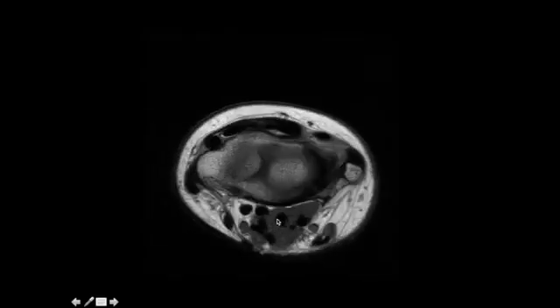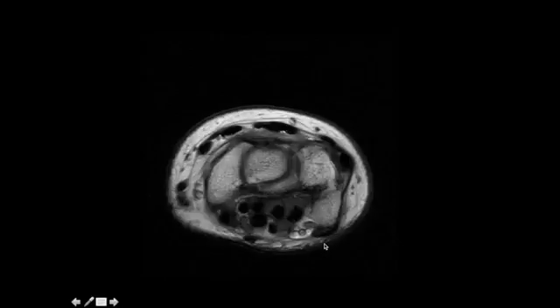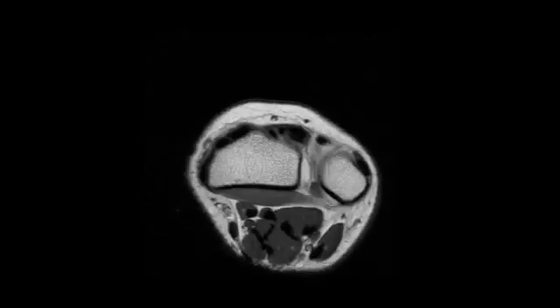More along the ulnar margin, we see the flexor carpi ulnaris. The flexor carpi ulnaris will extend distally to insert into the pisiform, and then via ligaments into the hamate bone via the pisohamate ligament and the fifth metacarpal bone, forming the pisometacarpal ligament.